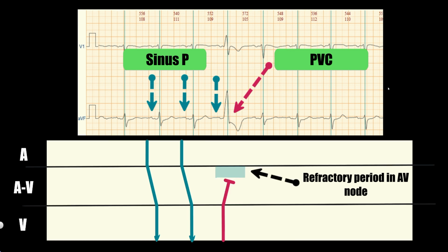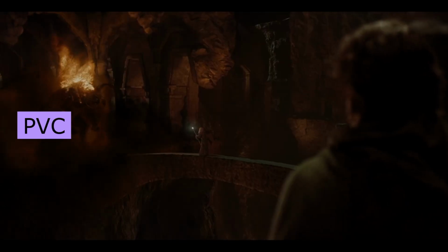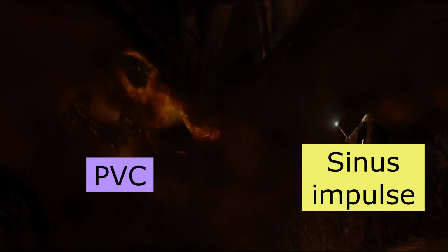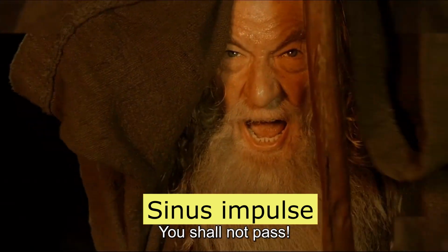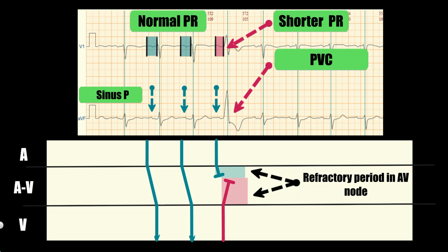So the PVC impulse can't pass through the AV node due to the sinus impulse-related refractory period, and the sinus impulse can't pass through the AV node due to the PVC. The PR interval between the sinus P wave and the PVC is shorter than in regular sinus rhythm.